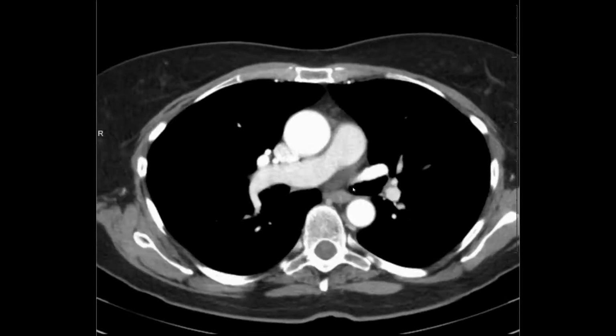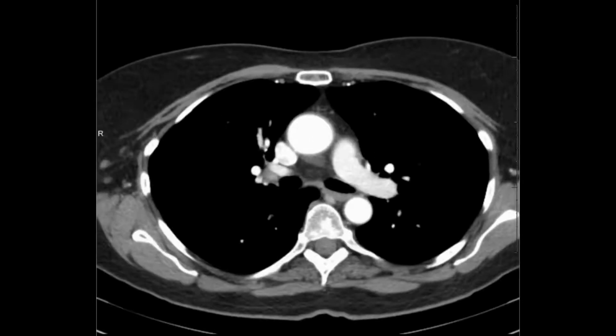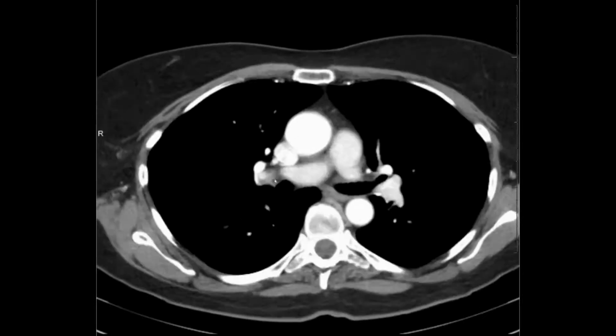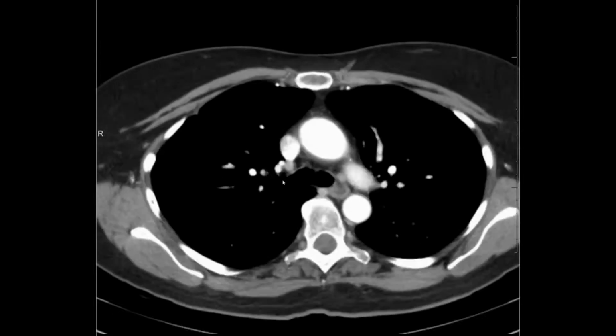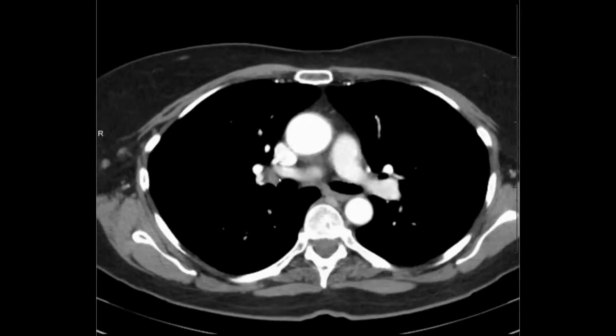Looking at the other side, because that's a completely different stage. And then I want to look for that subcarinal node, which is nice and flat. That one's typically a lot bigger than the other nodes, but it's only maybe about 5 millimeters. The one tricky thing that I had a really hard time evaluating when I was in residency was looking at this perihilar node, this little pancake here.